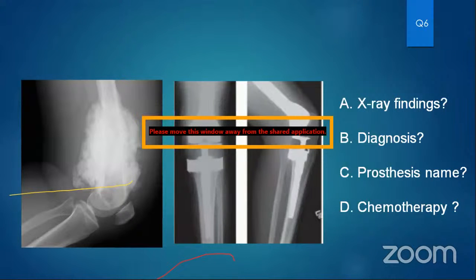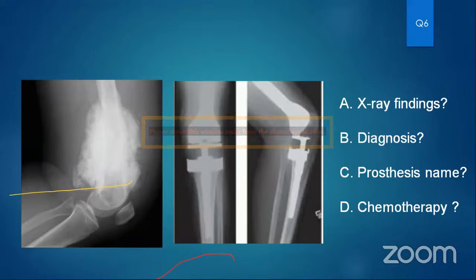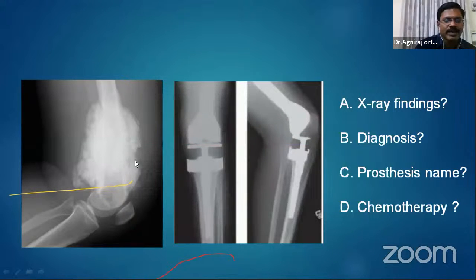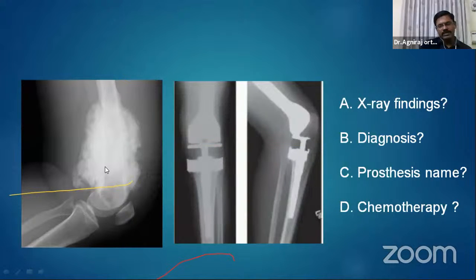Periosteal reaction, sir. Complication: no cortical break, sir. Periosteal reaction seen, sir. No pathological fractures. No pathological fracture, good. Okay, cortical breach, I think cortical breach. Yes, sir, cortical breach seen, sir. Periosteal reaction, and you told cortical breach. So what is your diagnosis?